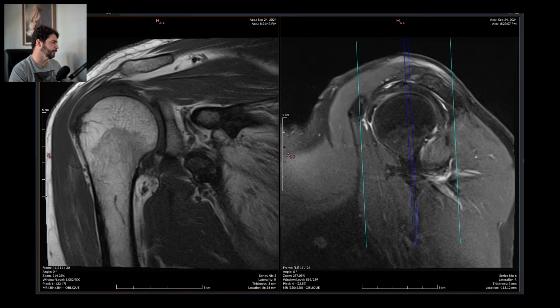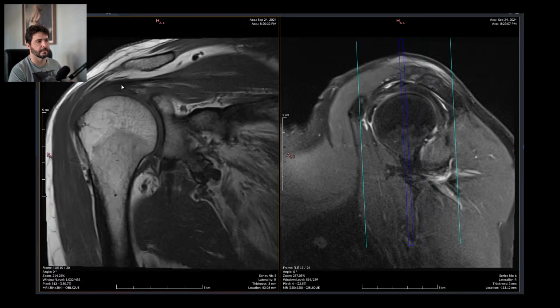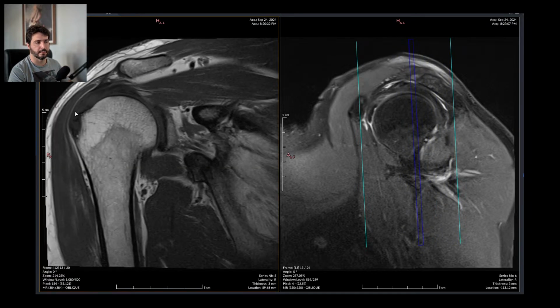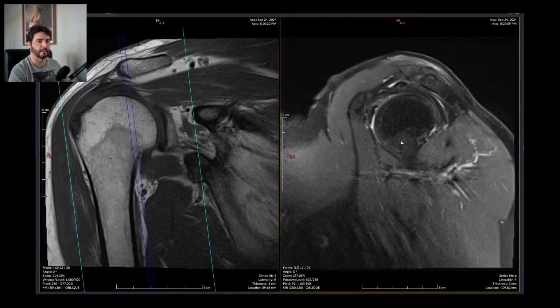Yeah, and Radiopaedia also calls it os acromiale. So this is prone to arthrosis, just as we see right here. So there is os acromiale, and right there, the edema is black on T1 weighted images.